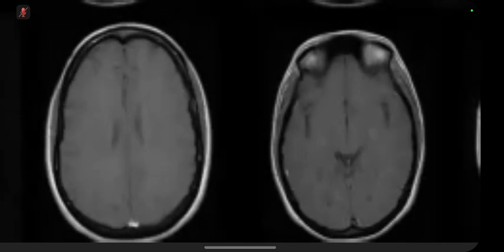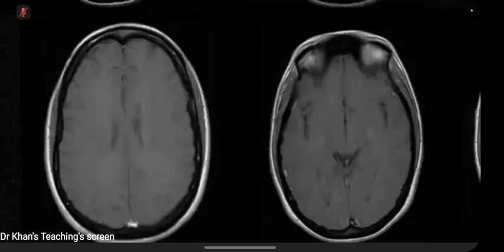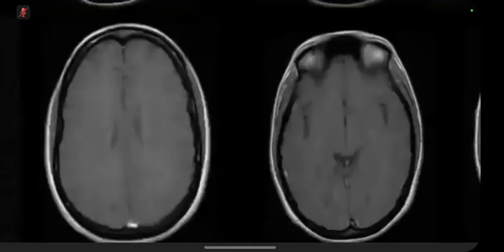I don't think there's enough information. We have got some periventricular lesions, but I can't see any cortical lesions or infratentorial lesions. And if we don't have any previous imaging for comparison, I think it wouldn't be enough to diagnose MS, so probably need further imaging to evaluate and to see if there are any new white matter changes. Okay. We can diagnose this as MS.